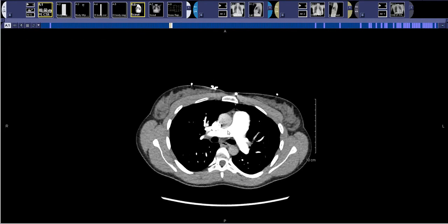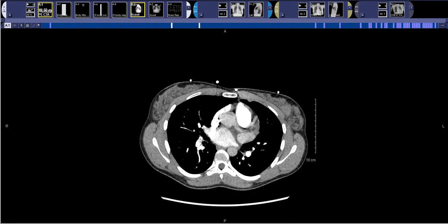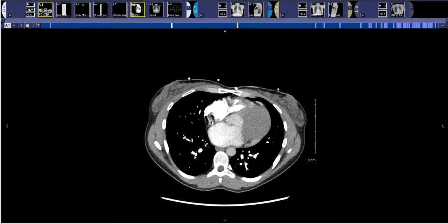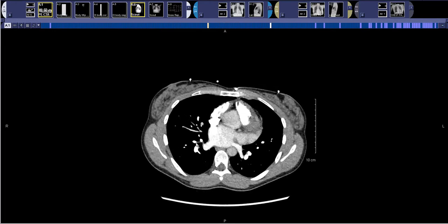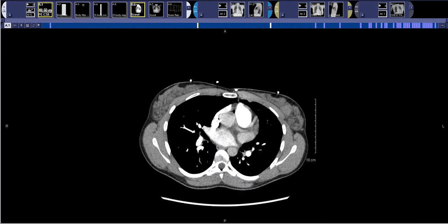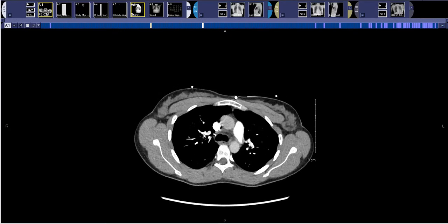At that point, I just pick a side. Usually I start on the right, and I follow down to the lower lobe pulmonary arteries, and then I'm just looking at the pulmonary arteries as they all branch off. I'm looking for any sort of filling defect within the pulmonary arteries. Then I come back up, following some of these arteries back up, and then I look at the middle lobe pulmonary arteries on the right, and then I switch to the upper lobe pulmonary arteries on the right.